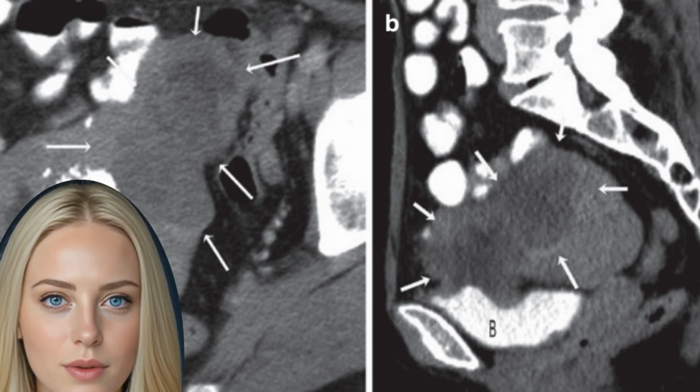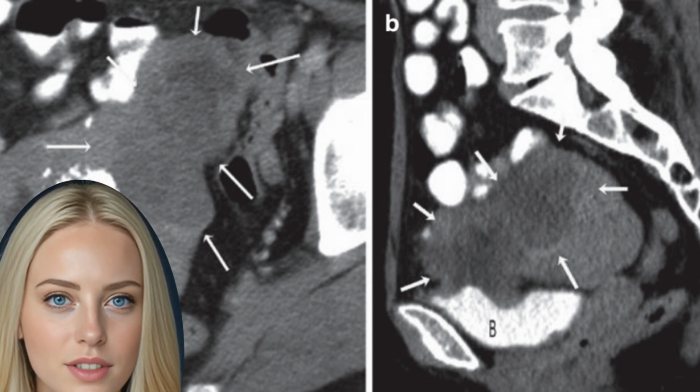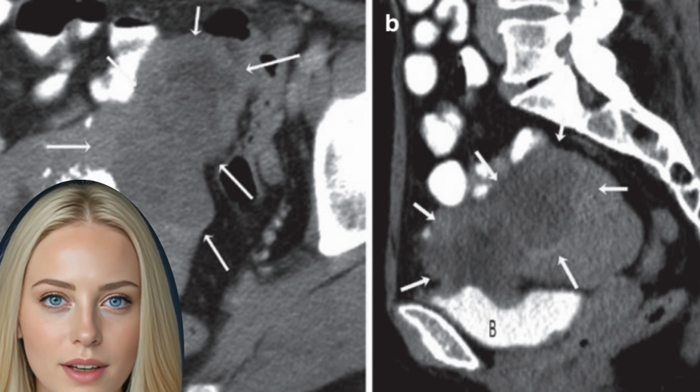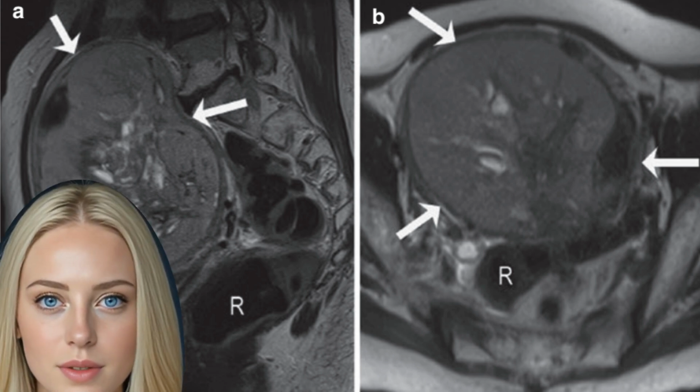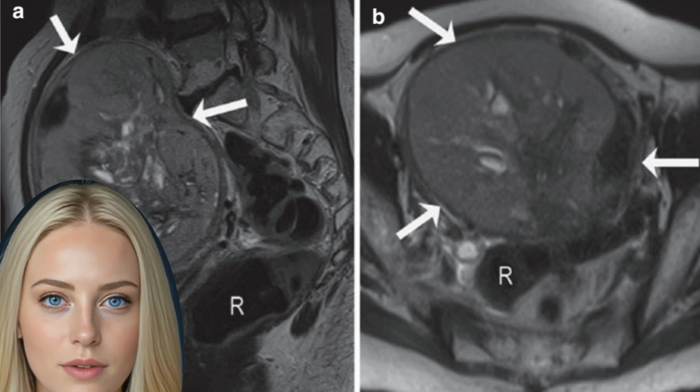Endometrial stromal sarcoma commonly represents an infiltrative mass with cystic parts. The endometrium, as well as the myometrium, is involved. Leiomyosarcoma, however, is mostly shown through heterogeneous signal intensity with a fuzzy boundary. Commonly, at least 50% are hyperintense on T2WI, with additional hyperintensities on T1WI.